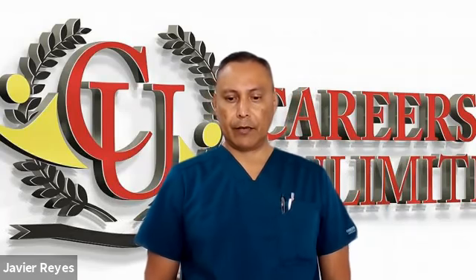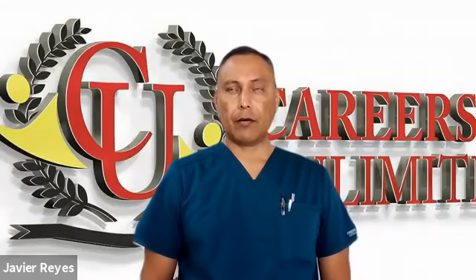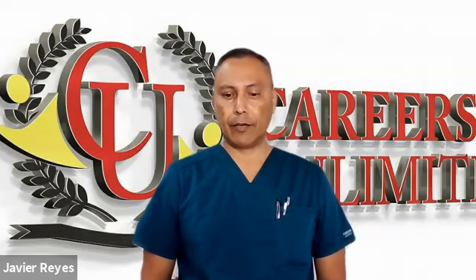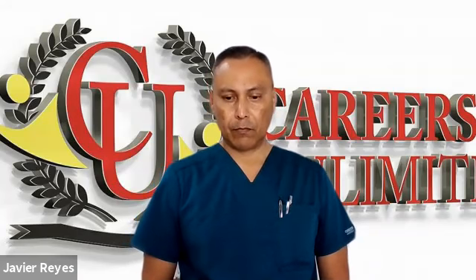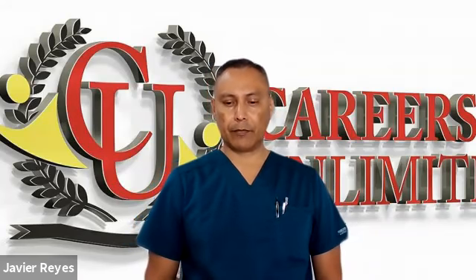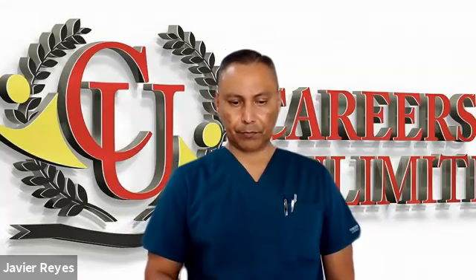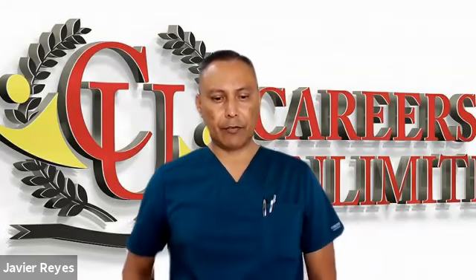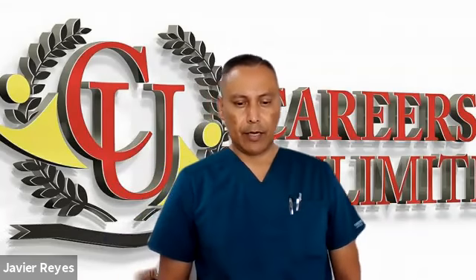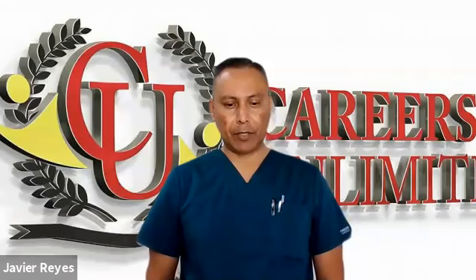In letter B, what do you see there? It's a typical RSR, or rabbit ears, that you see. That would characterize it as a right bundle branch, I'm sorry. So the QS complex that you see on letter A, a deep QS with no preceding R, can indicate a left bundle branch block.